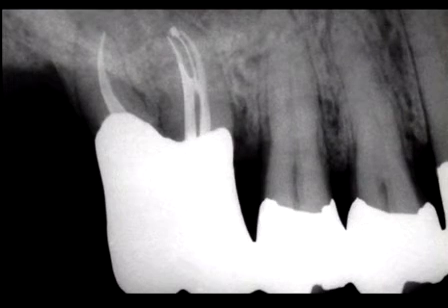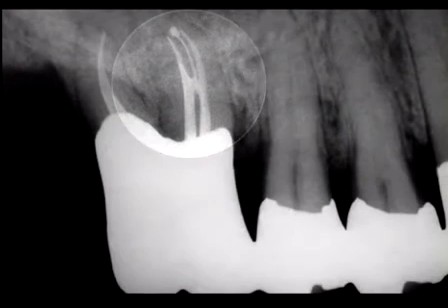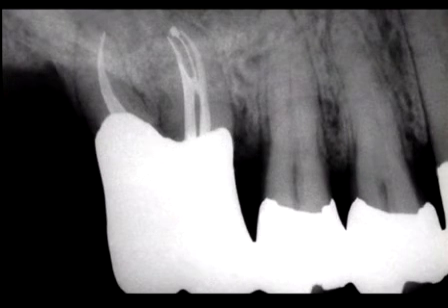This maxillary first molar has had interdisciplinary treatment. The palatal root has been resected, and endodontics has been performed on the buccal systems. Notice the MB root. Between the MB1 and the MB2 there's anastomosing, and off this anastomoses there's another system, and the puff is at that apical portal of exit. There's enormous potential for restorative success if you trust your endodontics.